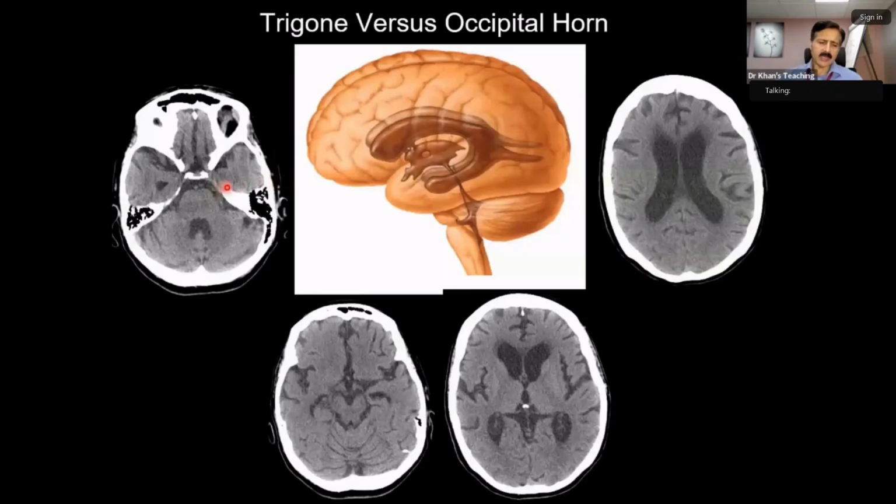Now, anatomy-wise, a few things for the trauma world are important. Look at this. This is the level of the pons, and this is the level of the midbrain. The pons has got this belly; I call it the fat man. And this is the midbrain, which appears like a Mickey Mouse. Now here, this is the cerebellopontine angle cistern, and this one. This cistern is important for you vis-a-vis herniation.